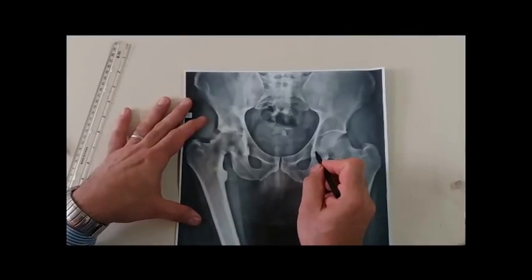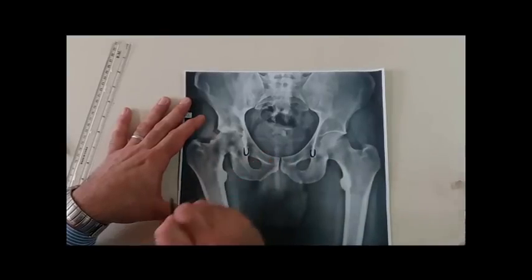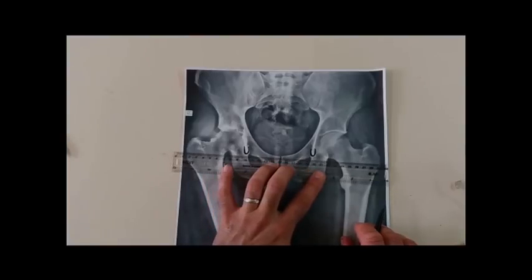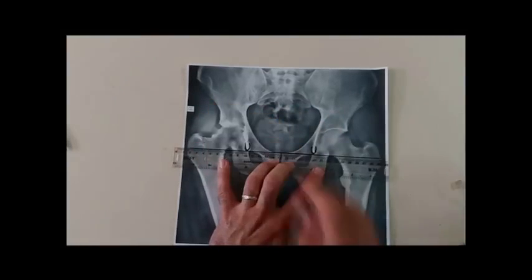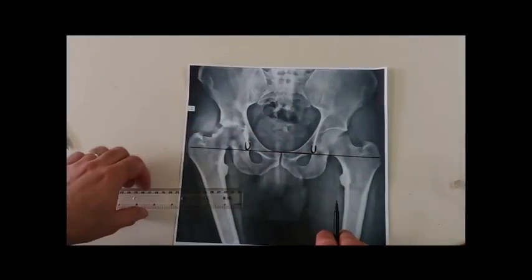The most consistent landmark on the pelvic side is the teardrop. This is the teardrop. We should draw it like this, U-shaped. In addition to that, the other side. The interteardrop line is the second landmark. It is a reference line, or what we call a leveling reference line. If the pelvis is already tilted like this or that, we can compensate for this tilting by the interteardrop line.